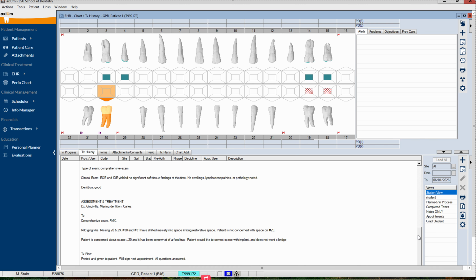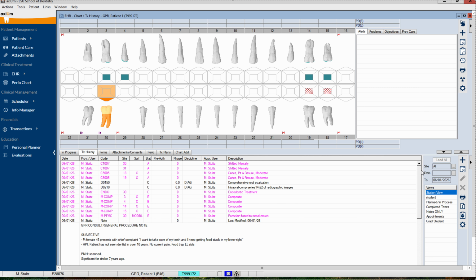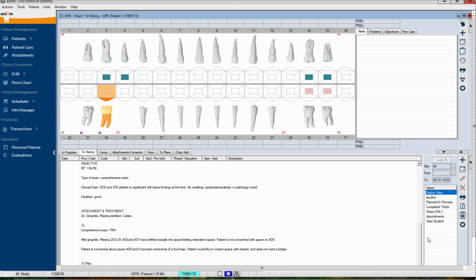Make sure if you need to email any scans or email or write any lab slips or send any prescriptions in, do that. You'll also add that in here. So if I scanned anything or have anything to send out afterwards, we'll go ahead and do that. Or if we've got stuff to pour up in the lab, do that as well.